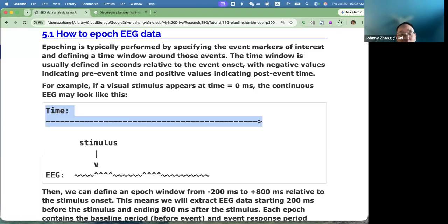So this is basically the experimental condition. Therefore, in our data analysis, maybe only the information here is most useful to us, because we want to see how the brain responds to this stimulus, right? This part of the recorded information may be most relevant to our study. Similarly, maybe we have a different image here, and then only this part of the signals will be useful. The signals in between may not be very useful for our experiment.